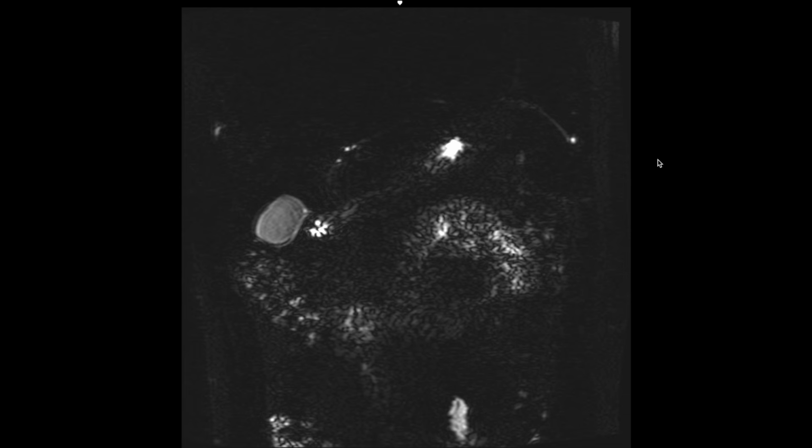Next, we talk about our MRCP images. As you can see, our MRCP images are just very heavily T2 weighted images. So things like the duodenum here that's filled with fluid is going to show up as bright. But what we're trying to focus on here is the biliary system. So this is the CBD that's quite beautifully imaged. We have our intrahepatic ducts here, with our left hepatic ducts going to the left lobe here, and our right hepatic ducts on this side over here.